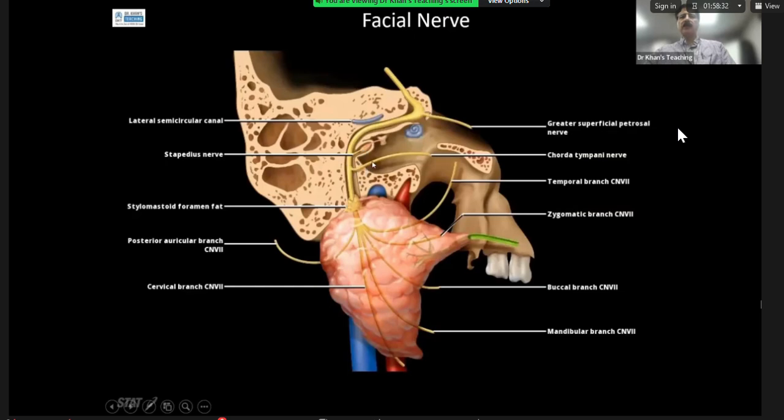There is another nerve here, which is known as chorda tympani, which actually on a CT scan, you can see it on a sagittal sequence. It comes out and passes through. Chorda tympani supplies, what is it, candidate 2? Chorda tympani. What do you know about it? It's the tongue. Yeah, good. Posterior 2/3 of the tongue. Anterior. It supplies anterior 2/3 of the tongue.